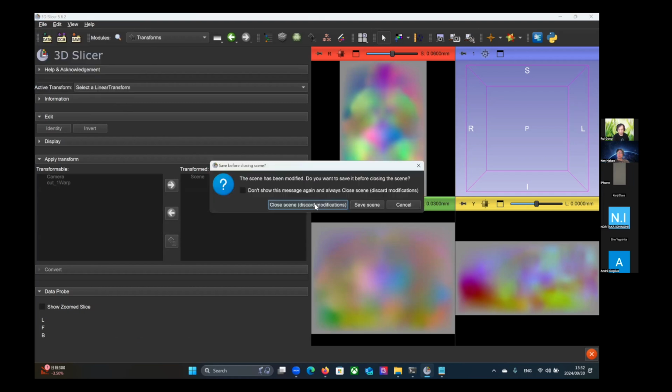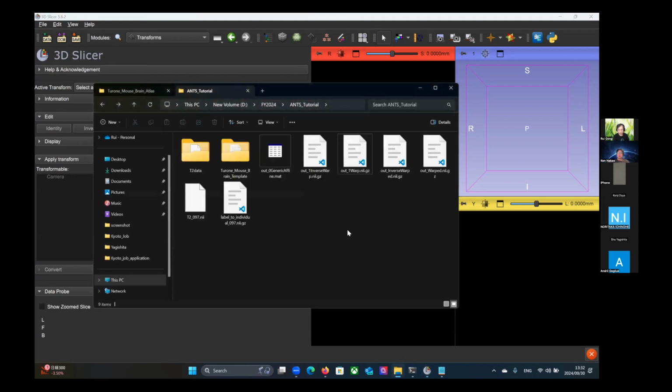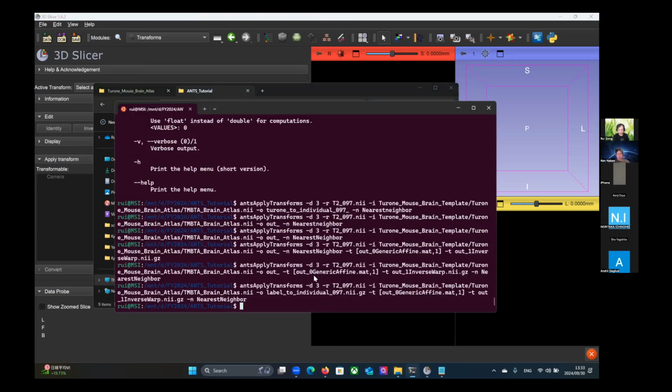So what you have shown is after using this nonlinear transformation, right? But I see this and the affine, the inverse one. Yeah, both. Then can you try to apply not affine but more both? Yeah, both. So here we are applying the inverse.